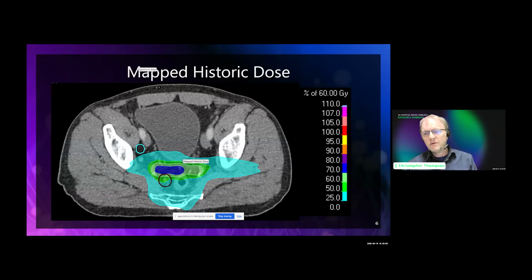Now, not everywhere has got deformable registration commissioned. So in that case, I suppose you would be trying to do a rigid registration and maybe focusing on the rectal wall as a matching structure. Or if you weren't happy, maybe particularly in the pelvis, like Jakob said, you may go back to doing a point dose assessment initially. But then you can still use all these EQD2 tools to remove some of those manual calculation steps, which would also streamline your processes.